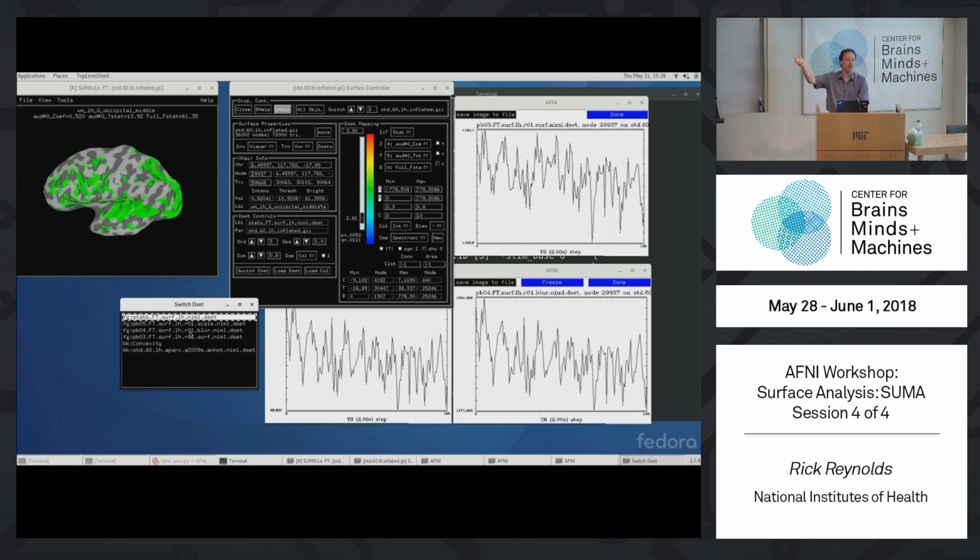So we can choose any of them to be the one we're driving in this data set mapping display over here. Yeah, and if you want to imagine getting complicated, hopefully Daniel will dazzle you tomorrow. You can do a lot with this stuff. So anyway, we will be kind and gentle today.